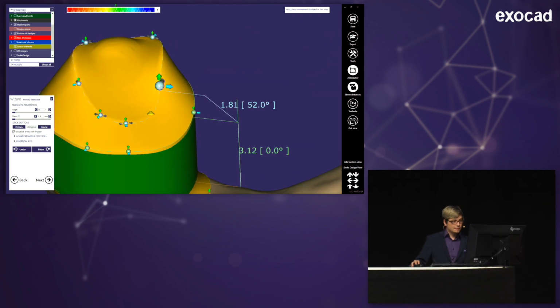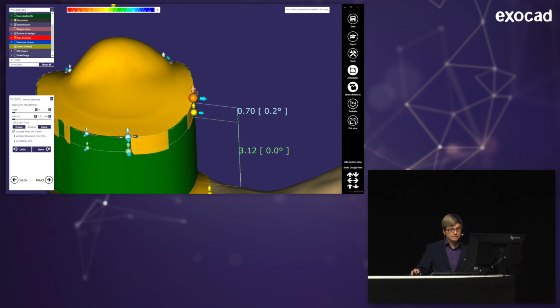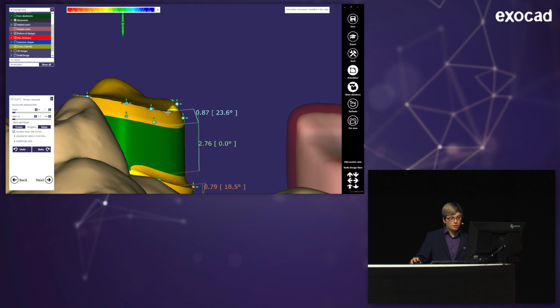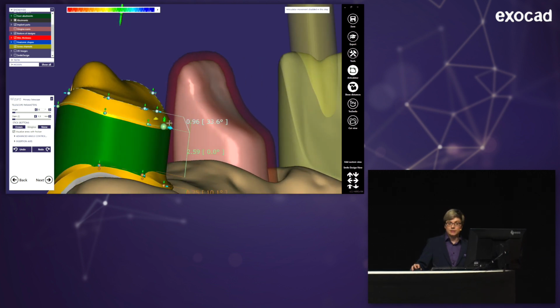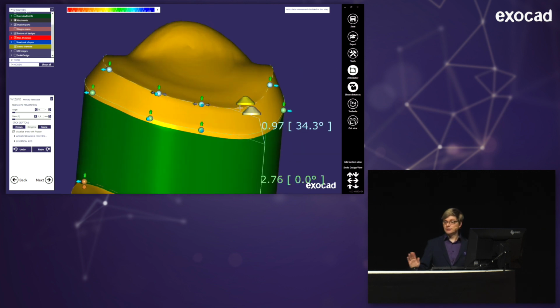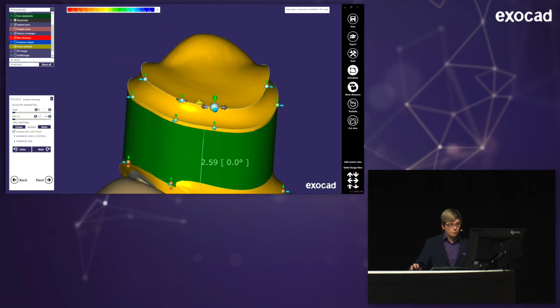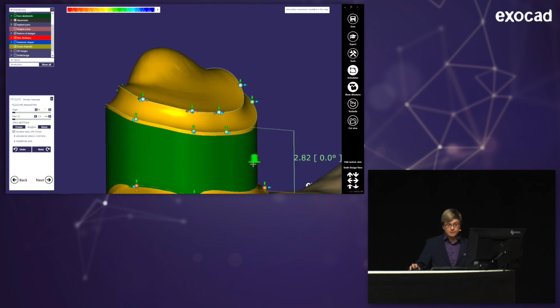Because now I'm taking all the upper control points, pull them out as far as I can, pull them down, up again, and a little bit inward. And so they're all at the same position regarding the lower control curve, or the middle control curve. And if you ever design telescopes using this module, you may have seen those weird yellow and green buttons and maybe already hit them by accident and wondered why everything looks different now. Those actually show what kind of surface the area between 4 points is. The green one is the parallel surface. The yellow one is just a conical surface. So if I hit this, it changes.